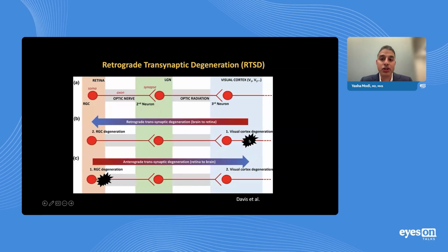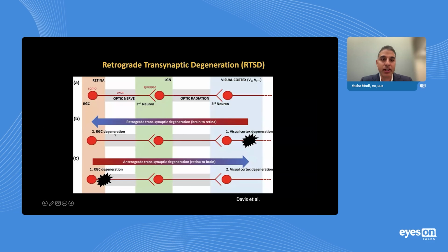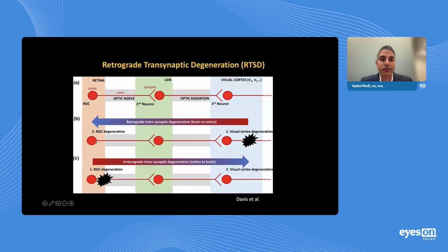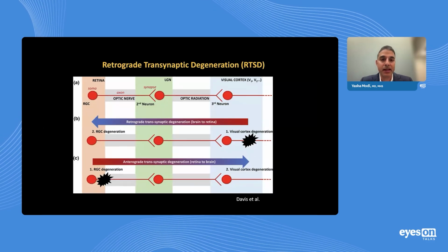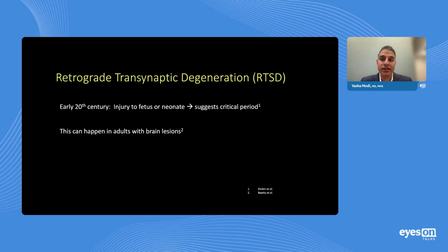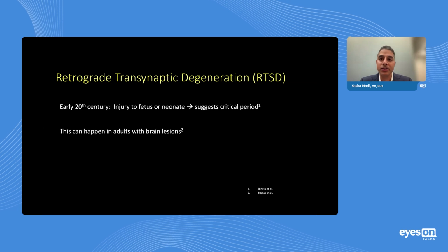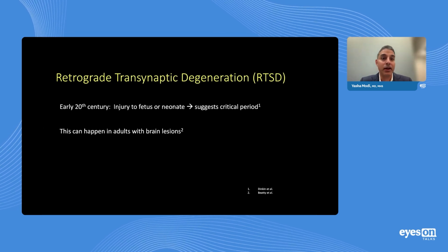Conversely, you can injure any part of the brain, and through retrograde transsynaptic degeneration, that effect goes all the way back to the retinal ganglion cells, and we can pick that up on our nerve fiber layer analysis and our ganglion cell IPL layer analysis. And I specifically say both because the nerve fiber layer would be totally normal, and I'll show a case of that.